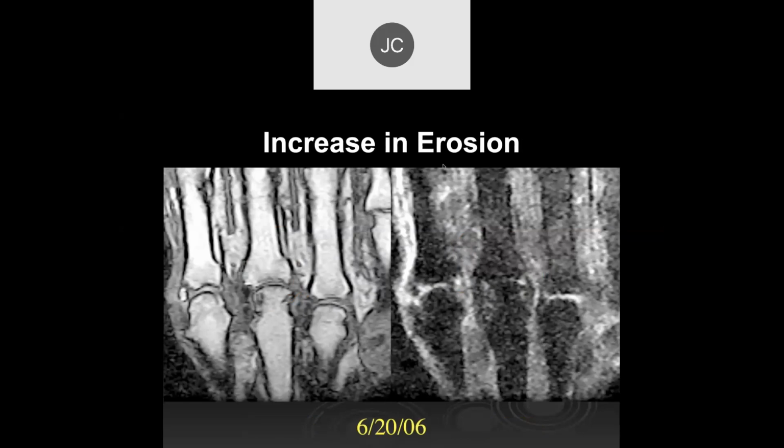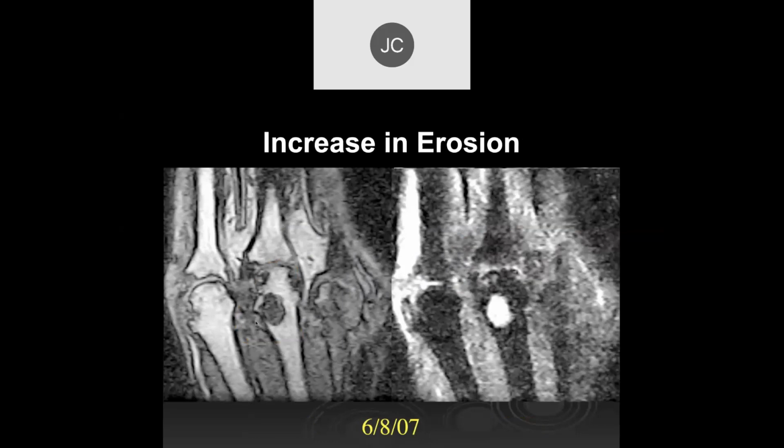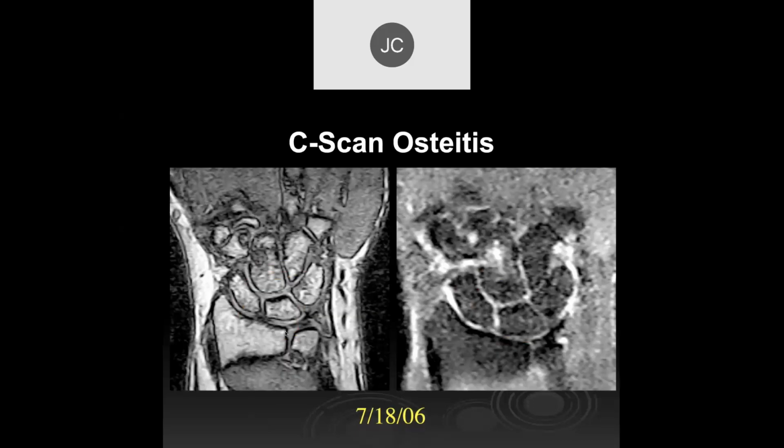And this is 6/20/2006. Again, these low-field scans, we can see a lot of marginal erosive changes. And if you follow it over time, marked increase in the erosive changes. So again, MR is by far the best way to follow erosions. And now for clinical trials and looking at effective treatment for inflammatory disease, generally the FDA requires MR data in following those patients, even though MR is not used that much clinically in following individual patients. It's important data for clinical trials.